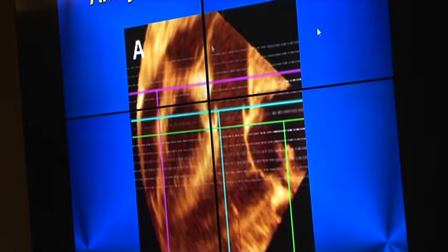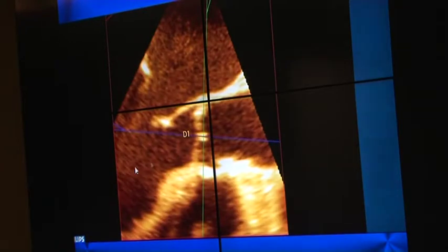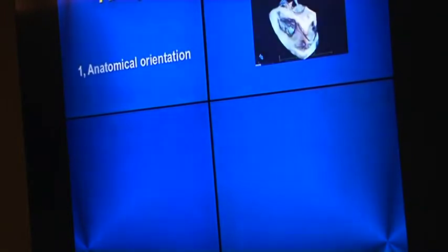But if we go further, we can analyze the aortic root and measure the height of the cusps in open position, the diameters of the root at different levels, the intercommissural distances, and the length of the coaptation. It should be at least 4 millimeters after valve repair to be competent. How do we analyze the coaptations? First, we will do it in the afternoon if you are interested.